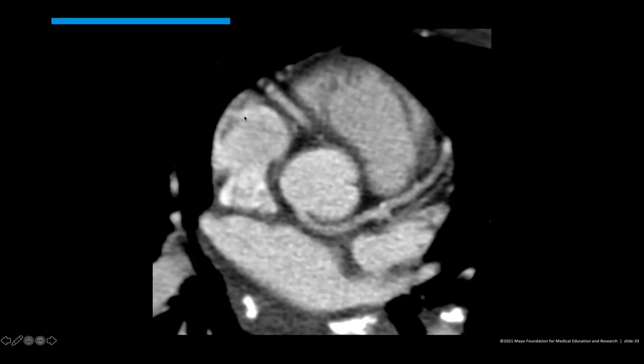See how that right atrial appendage is right next to the right lung? And we see a little bit of the RVOT or infundibulum up there anteriorly. The right sinus is going to be directed towards that groove. And then the posterior or non-coronary sinus is going to be directed towards the interatrial septum.